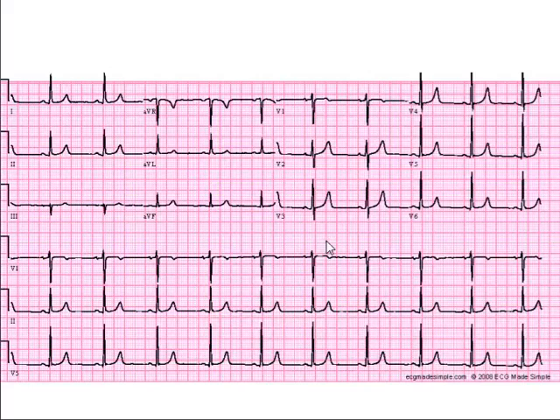For right ventricular hypertrophy, we look at the axis. Because there is no right axis deviation, and the RS complex in lead V1 is normal, there is no evidence of right ventricular hypertrophy. We now move to assess for the presence of infarction.